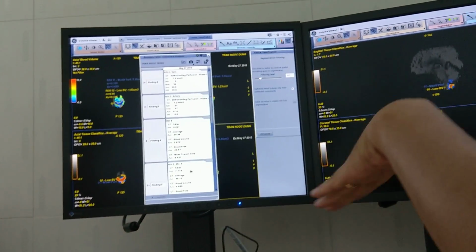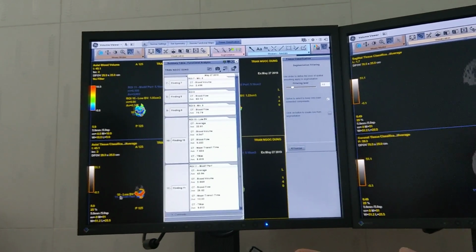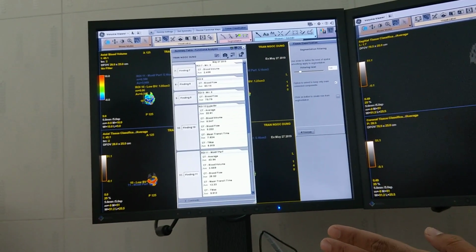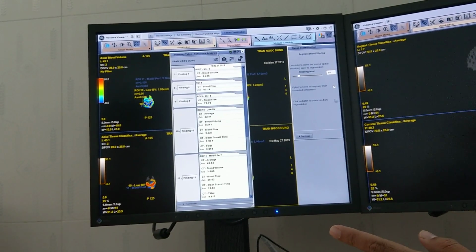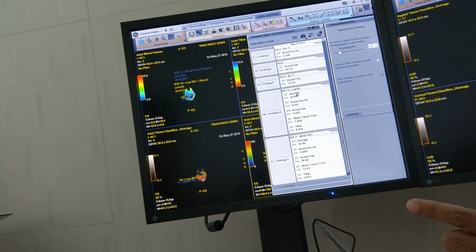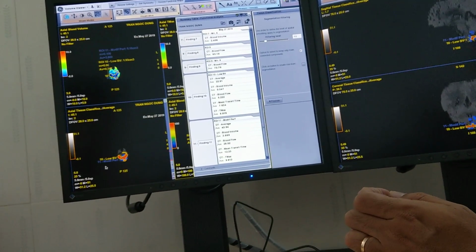So all this is the report. You want to look at number 10, ROI number 10. This is ROI number 10. So the low blood volume, you look at the average because this is the average map. So you look at this, or you can also look at here, it is the same. So this is the more, 22.81 is the number 10. Right?